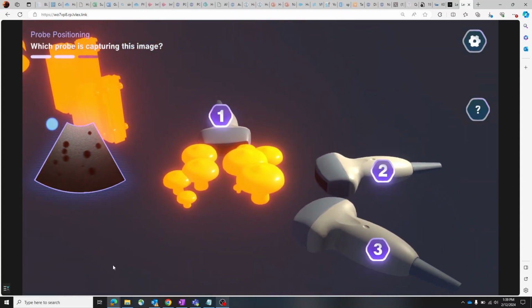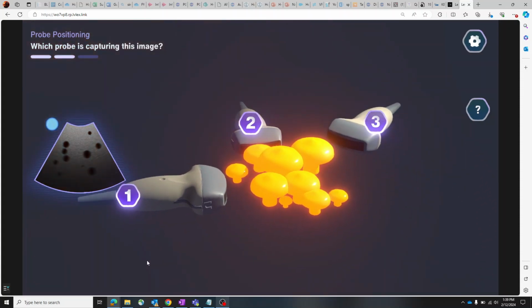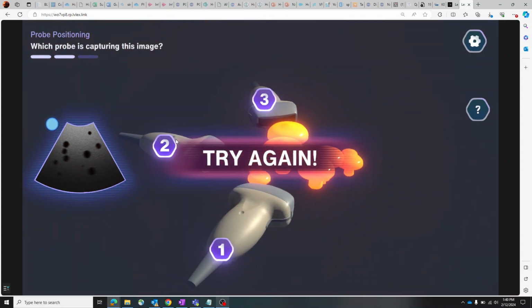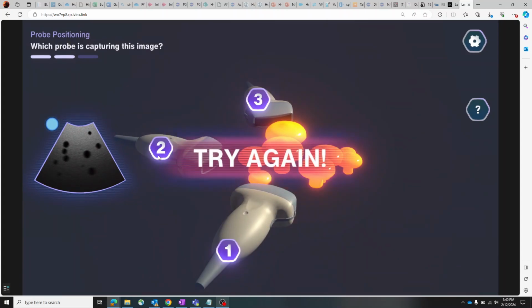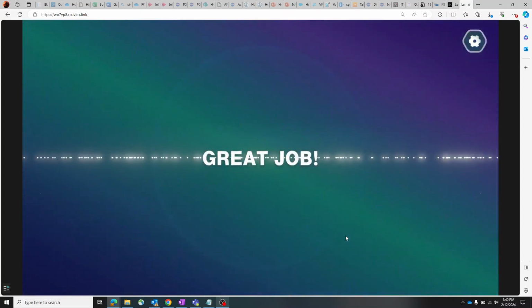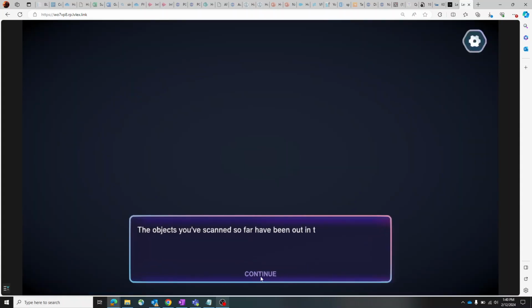Yeah. Here we're getting into the procedural guide. So here we're going through the IJV assessment, and first up is the first of our 3D models, where we're showing users how to hold the probe. We had a little bit of iteration around here when Aaron so graciously gave us time to show us how they train ultrasound. He demonstrated how to hold the probe for a self-scanning assessment. So we used that as our guide to model this hand.